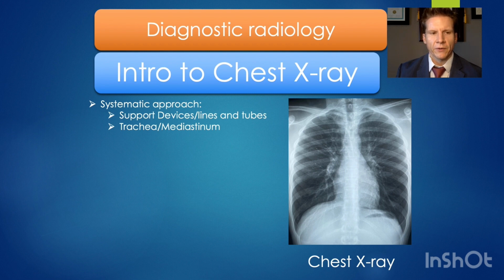And after that, when you start to look into the lungs, you can divide those into thirds. So you can have the medial third bilaterally, then the middle third, and then the outer third. Now, it's important to recognize that in this inner third, the hilar structures and the vasculature are going to be very prominent, and as you go out towards the periphery, the lung markings become less and less prominent, to being very faintly visible along the periphery towards the pleural surface. From there, you want to take a look at the upper abdomen and diaphragm.